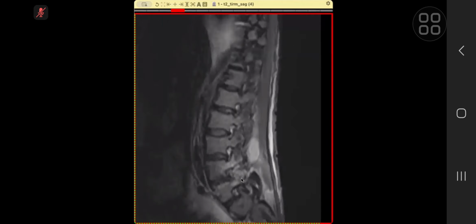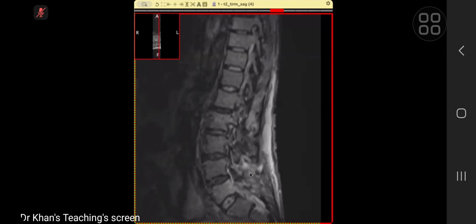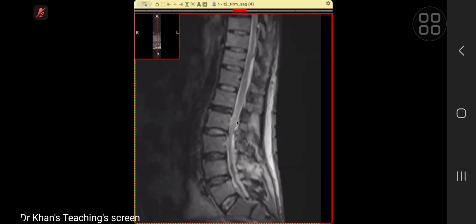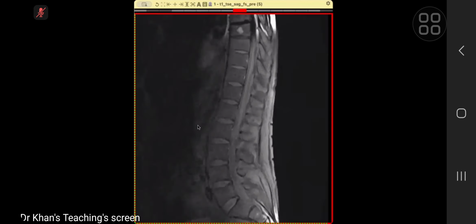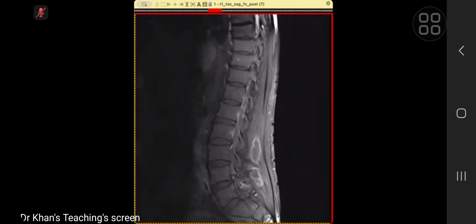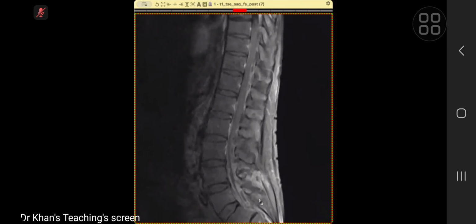Posterior elements, abnormal marrow signal, which was low on T1. Now you can see this is high on the STIR sequence. And with that, of course, we will see on post-contrast, what this was, of course, the pre-contrast fat saturated. We have got posterior paravertebral abscesses. We have got involvement of the posterior elements at L4, L5. We can see a lot of enhancement, meaning phlegmon.